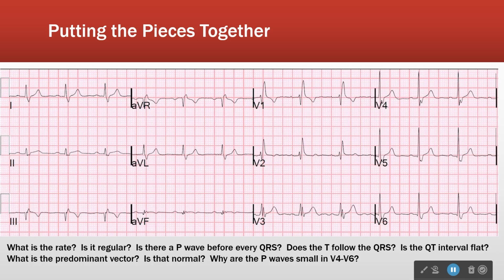Is it entirely flat? I would say no, actually. I'm not convinced this is a full-on STEMI, but there are some ST changes, right? Those of you who have more electrophysiology experience than I do would probably be able to tell me exactly what it is. But there is a little.